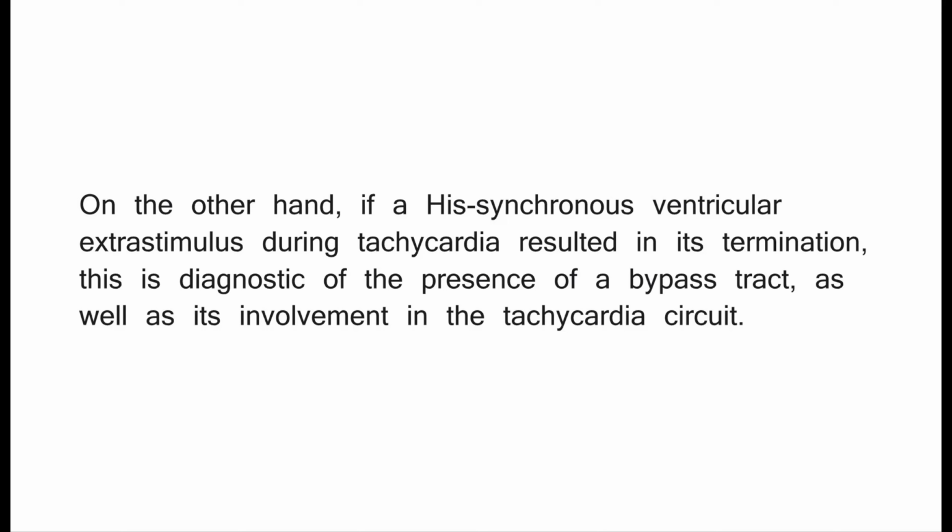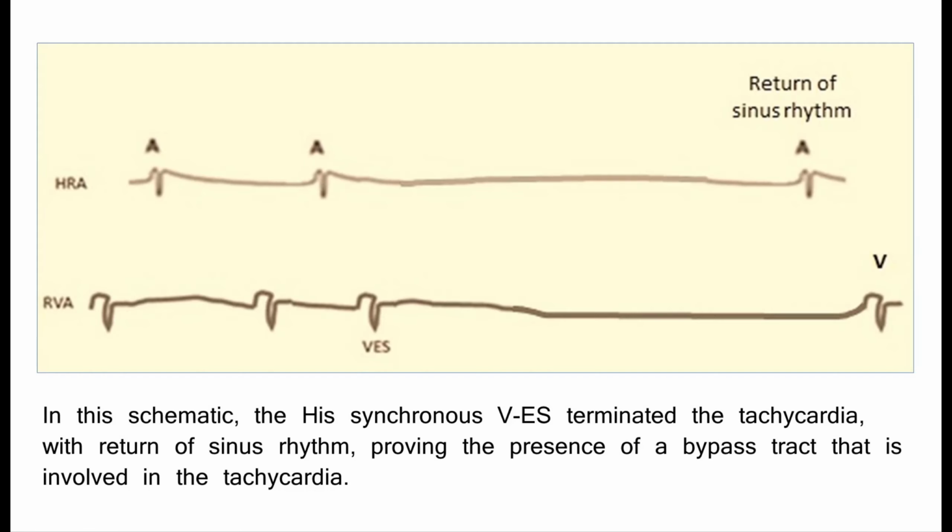On the other hand, if a His-synchronous ventricular extrastimulus during tachycardia resulted in its termination, this is diagnostic of the presence of a bypass tract, as well as its involvement in the tachycardia circuit. In this schematic, the His-synchronous VES terminated the tachycardia, with return of sinus rhythm, proving the presence of a bypass tract that is involved in the tachycardia.